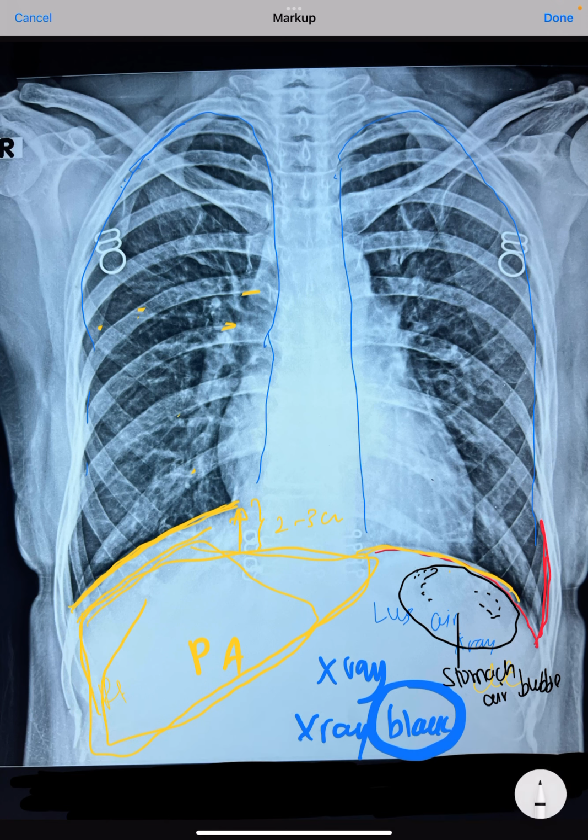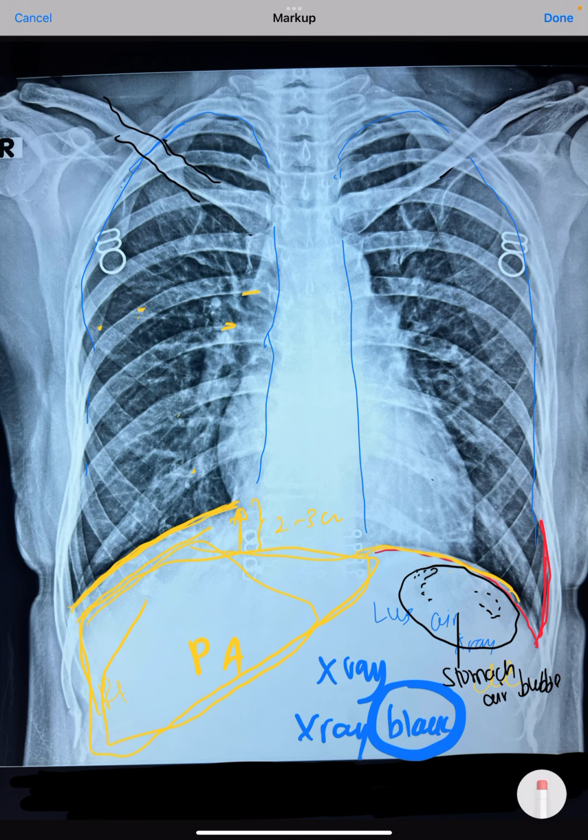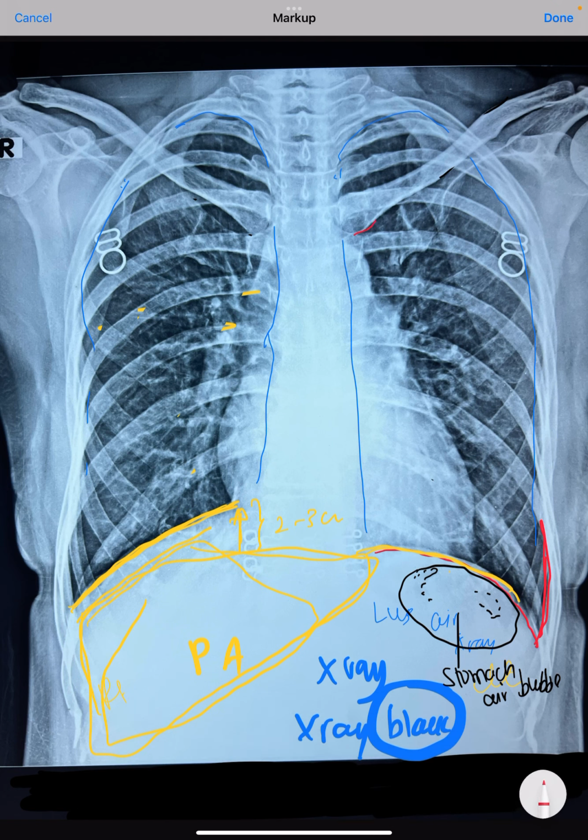This is clavicle, one of the most important landmarks on the chest X-ray. These are the two clavicles. Most of the time in road traffic accident, you must see clavicle always because clavicle is one of the most common bones which gets fractured in road traffic accident. So to see whether this patient has fracture or not, you must trace the clavicle borders. Just make sure that this clavicle border is smooth. If the clavicle border is smooth, it means that there is no fracture. So just trace it from here up to acromioclavicular joint or up to this shoulder joint. So here both the clavicles are intact.